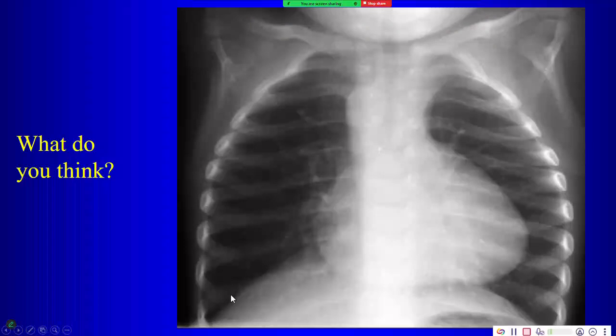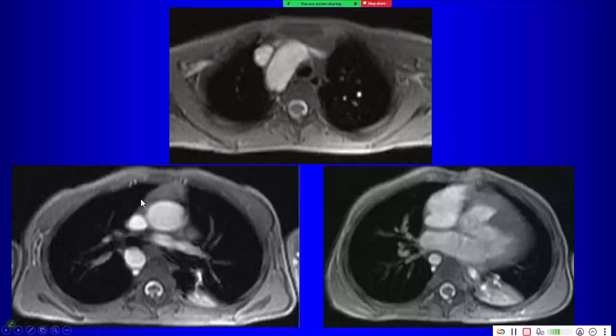Okay, so here's another case. Patient who has decreased pulmonary vascularity, will be cyanotic, upturned apex, right aortic arch. So by all rights, this should be another case of tetralogy. But when we look at the imaging, of course, we have the right aortic arch, right? We have the ventricular septal defect. We have the right ventricular hypertrophy. Is there anything that looks peculiar here?